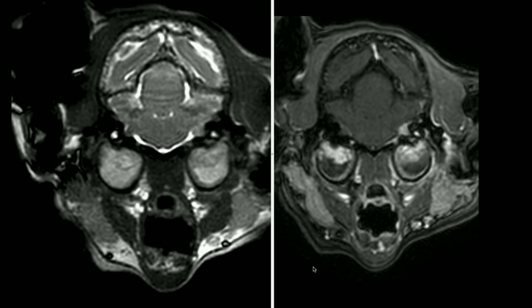In this particular case, there were some additional pulse sequences acquired which are really helpful when it comes to evaluating the cranial nerves and inner and middle ears. Here on the left, this is a balanced turbo field echo. This is a high signal sequence with high contrast, which is used primarily for looking at CSF structures and the inner ear.